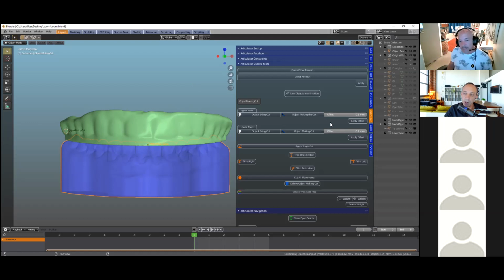So when you say go back, you just press Control Z several times until you get back to this stage, and then you go.